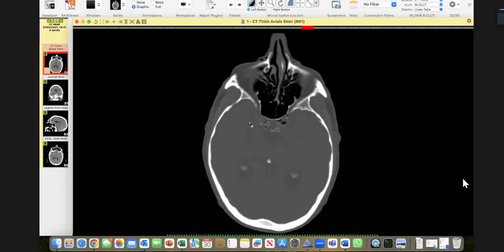You remember that heading, radiology knowledge, and then the clinical context of things. Please remember that the same case with intraparenchymal venous gas has come in the exam. Same case which I am showing you. So what happens is that this is an incidental finding. If you Google it, you can read a few studies.